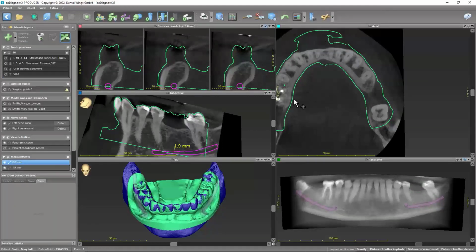Measurement means you make a starting point, you make an end point, and it's here on the left side. It's a so-called active measurement. As long as you are here on the measurement and it's blue, and the activation button here has a blue frame, this is important. You can only modify something on the left side if the modify button here is activated.